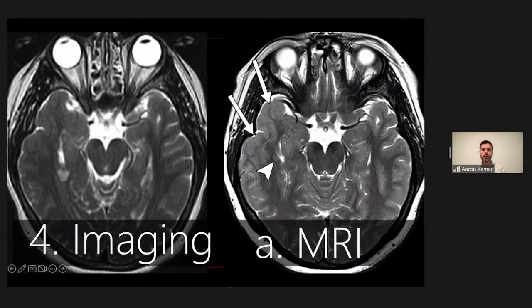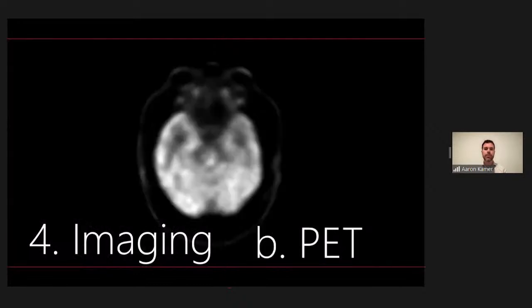This is a clear disorganized cortical dysplasia case, and there's a nodule of gray matter heterotopia here. This disorganized looking temporal lobe is almost certainly the cause of this patient's seizures, given the degree of abnormality in it, and it just doesn't show up nearly as well on the 1.5 Tesla magnet. So please know that our neurologists are often very interested in a full assessment with 3T.